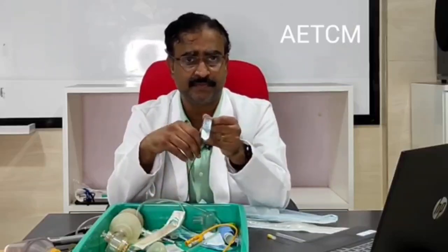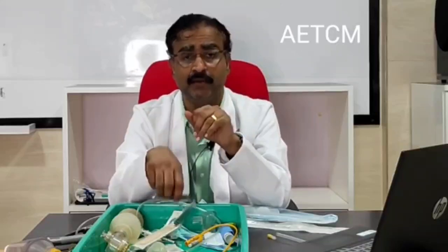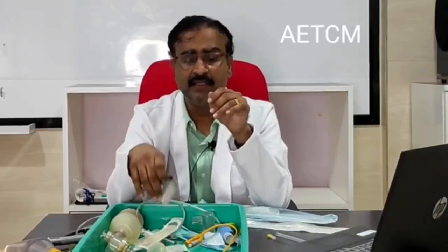Now, is there an absolute contraindication of using this? And the answer is yes. You should not use it in a child who has croup, C-R-O-U-P, or laryngotracheobronchitis or epiglottitis, to be more specific, because the moment you use this, the child is going to get very agitated, and the child's vocal cord may go into full spasm, and the child can actually virtually choke and die within minutes. So that is why you would never examine the oral cavity in a child who has croup. Croup has an inspiratory stridor, so in that kind of child you would not like to use this. So that is about the tongue depressor.